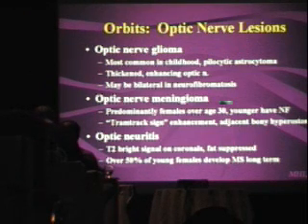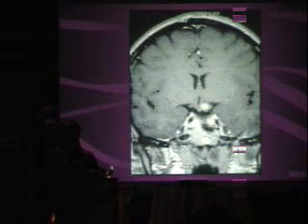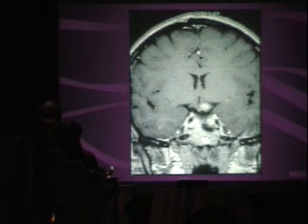The only other thing to be aware of is if you're looking for optic neuritis, which is not usually a radiologic diagnosis, you should definitely try to get coronals. Look along the optic nerve on coronal T2s to see if there's asymmetric brightness, or STIRs or T1s to see if there's asymmetric enhancement. If it's along the optic chiasm and you have an enhancing mass, in a child, what is that?